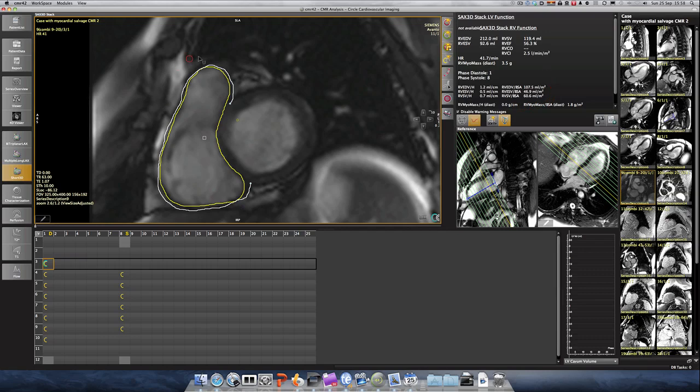I'm not going to show you that now because I think that's really something that we clinically don't do. It's only if you had patients with pulmonary hypertension, you wanted the RV mass calculated, or you want to look for changes following treatment. Otherwise, I think the quick clinical trick is to just measure the wall thickness, and if it's increased, you may want to document RV mass, and that's how you do it.